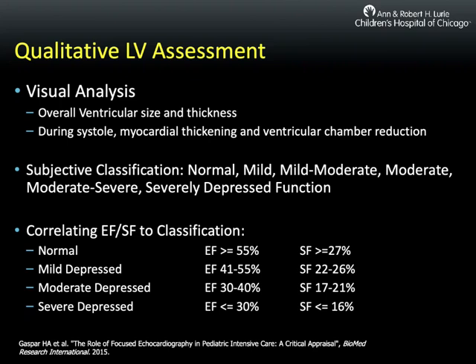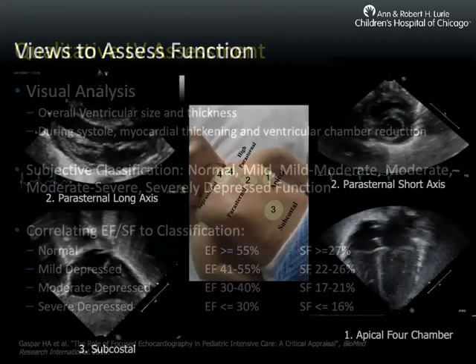This isn't clear cut, but many echocardiographers will correlate ejection fraction and shortening fraction based on these classifications below, as a rough ballpark to overall provide that qualitative LV.